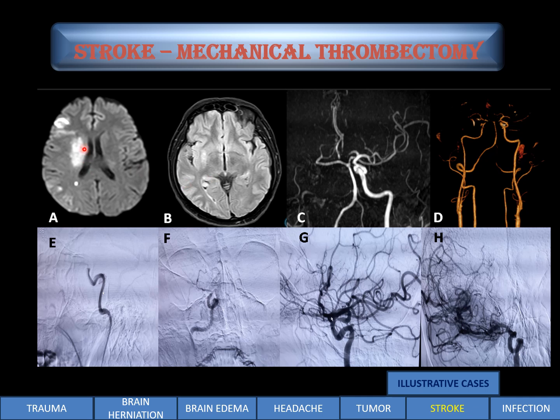Okay, so in this patient there's an area of abnormal diffusion. In a more inferior section, there's a subtle FLAIR hyperintensity which is seen. This is an MR angiogram image in which the right internal carotid artery is not at all seen. The right middle cerebral artery is not at all seen. Again, we did a CT angio. The same findings are confirmed. There is an attenuated caliber. So always, an MR angiogram overestimates the occlusion, and this is the right internal carotid artery, which is small in size when compared to the left internal carotid artery.